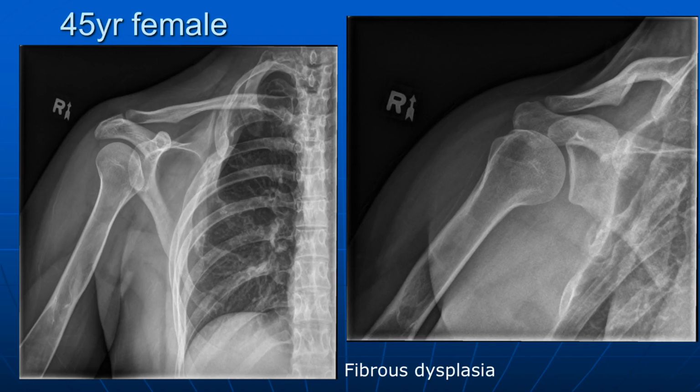Does it look anything like that patient with prostate cancer and the tibial lesion? It does a bit. Fibrous dysplasia, as it says, is a bone dysplasia, and it's where the normal bone is replaced by fibrous material. So it can give you this disorganized pattern, but it's essentially elements of the normal bone that haven't formed properly. So it can look like normal bone, but the bone is expanded and looks very strange. It's common in the upper limbs. It's the commonest rib lesion as well.